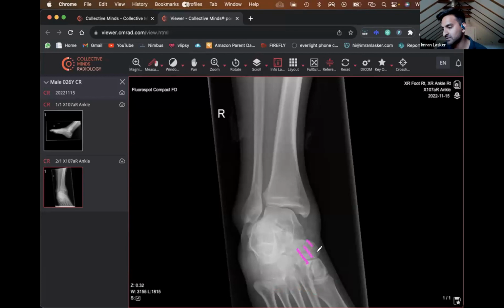I've seen fractures of the navicular pop up in these ones, so you got to be very careful. Then you look for osteochondral defects. So I know I'm doing things slightly backwards, but the way I do things, and I would encourage people to do, some things are just obvious. Fair enough. You see it, boom, you're done. But it's actually very important to look for the less obvious. And so over time, I've ended up making the less obvious things the things I look for first, and then go on to the obvious things.